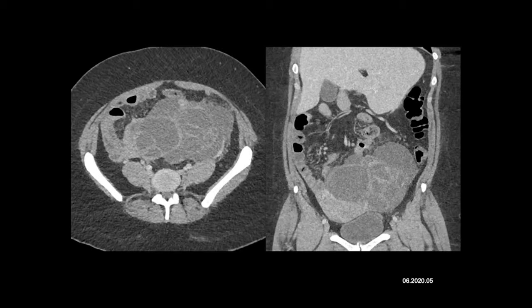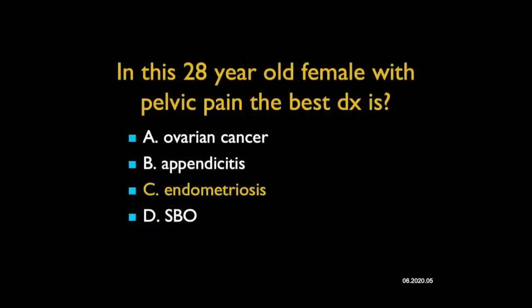This is not a missed appendicitis, and it's not dilated bowel. This was endometriosis. Endometriosis is a difficult diagnosis, many different appearances, and this is one of them.